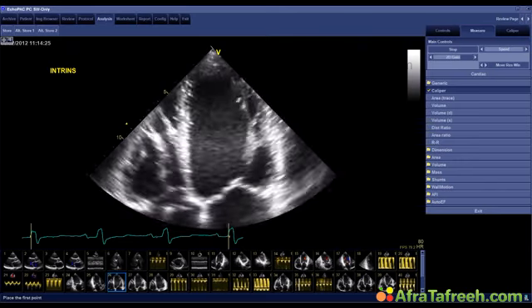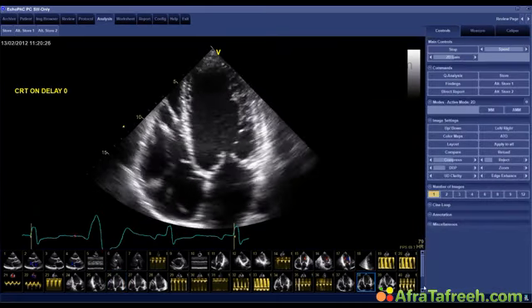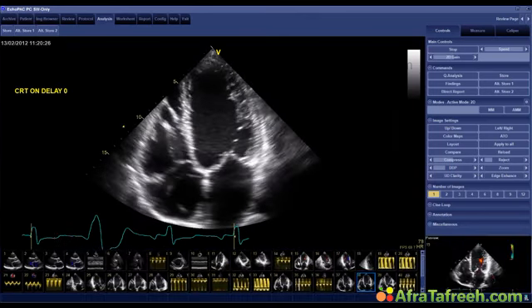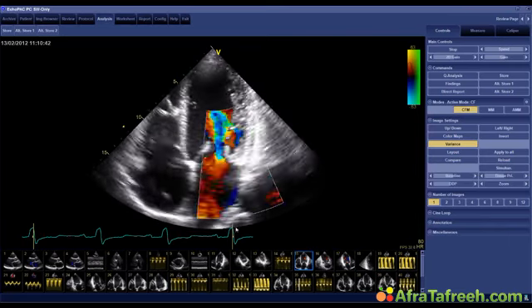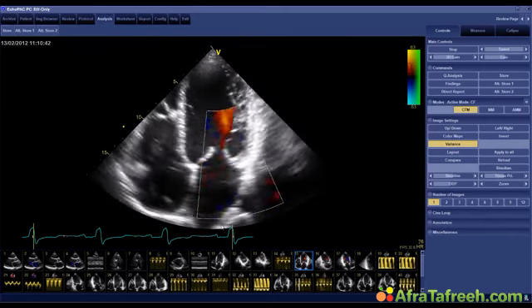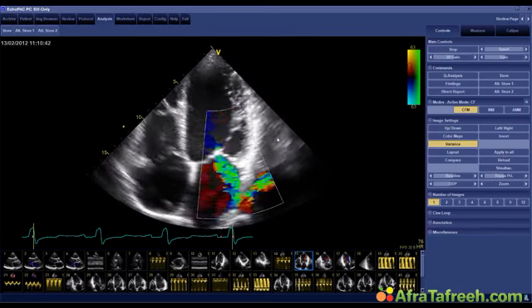Prominent trabeculations here in the right ventricle. Those are just some studies we did, and I'll explain to you later why we did them. But my question to you now is, do you notice anything peculiar about this case? Okay, he has mitral regurgitation. Well, the diagnosis here is cardiomyopathy. It's dilated cardiomyopathy, reduced left ventricular function in the setting of a dilated left ventricle.